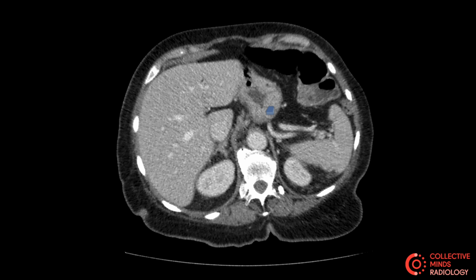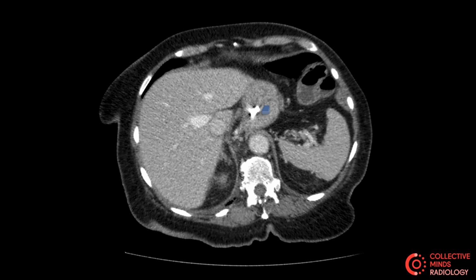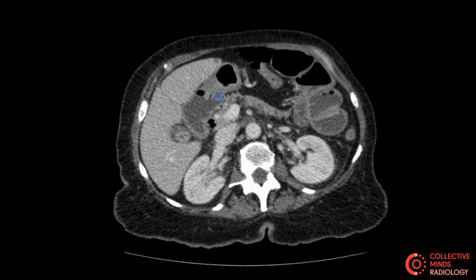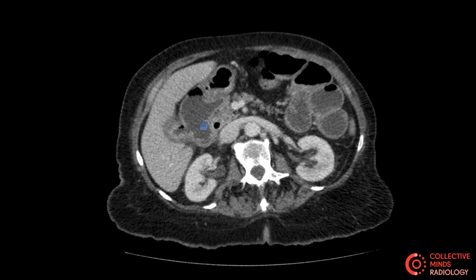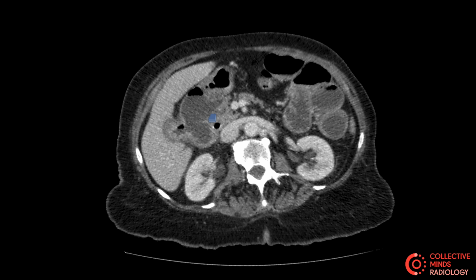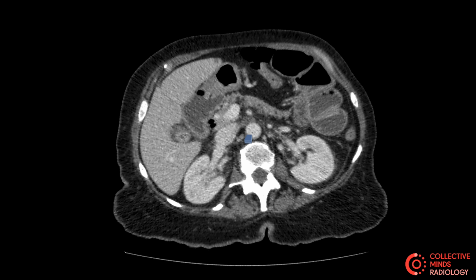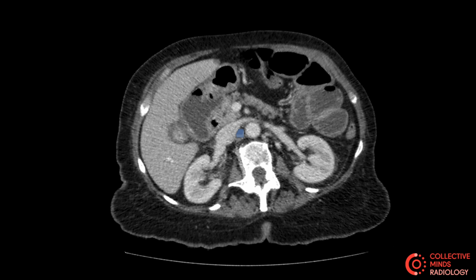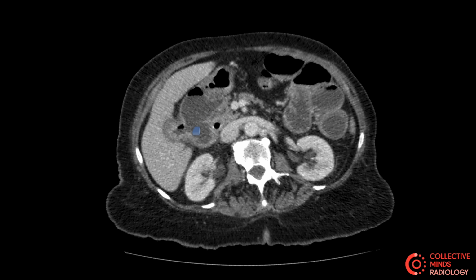Remember the stomach we're talking about sitting over here? Let's find that NG tube, follow this way, follow this way, follow this way, and then you're going to come into sort of D1 portion of the duodenum, and look at that. There is a definite defect located between the gallbladder and the duodenum. So that kind of raises alarm bells. Something has communicated between these two structures, and what's happened is that air has gone into the gallbladder and therefore into the biliary tree, which is what we're seeing.